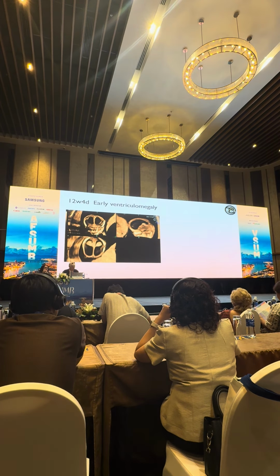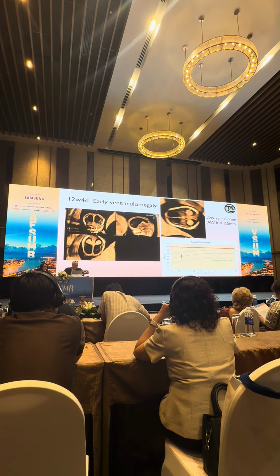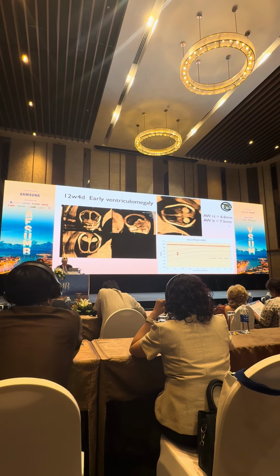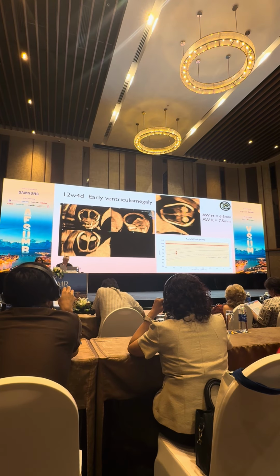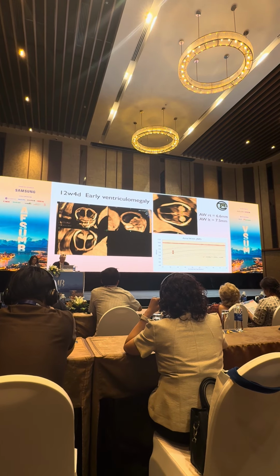Because all of the cases are below 10 millimeters, and the 12 weeks are ventriculomegaly cases. And if you measure, for example, the atrial width, this is 6.6 and 7.5. Of course, below 10 millimeters. However, maybe all of you agree with me that this is early ventriculomegaly, right?